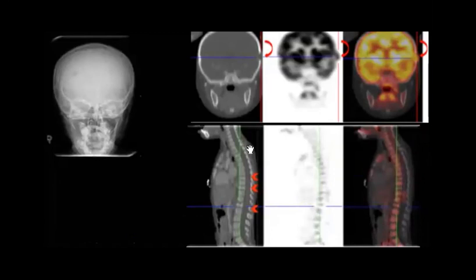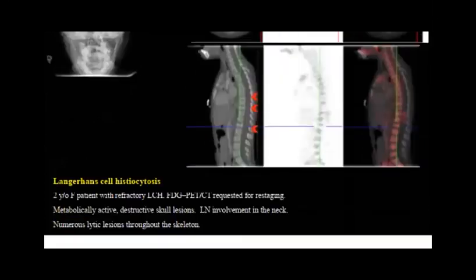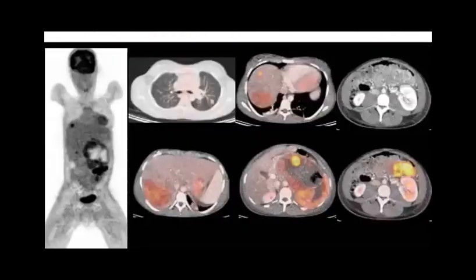Metastasis either, okay? So the age here is very important. Look at the skull, try to figure out, is it a young patient or old? I think he's young, very young. So about 2 years. This one is a bit difficult, but okay.